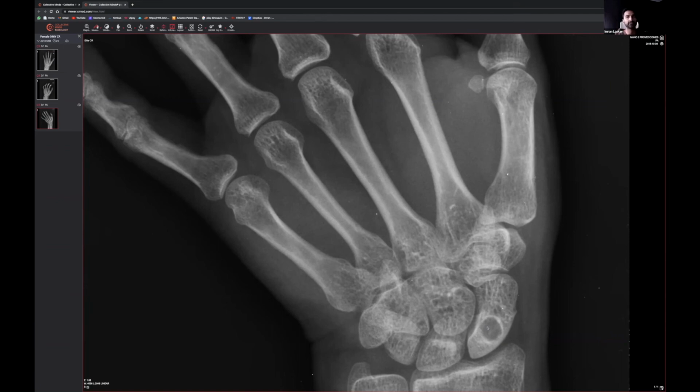And it's not just here you'll see these. You can see them on the shoulders, you can see them on the knee, the tibia mainly, actually. Now, you're not usually that bothered, but you have to imagine that you've got cystic transformation of the intraosseous structures, and that can actually result in slight weakness. So they can end up getting pathological fractures of these. So sometimes you do get fractures going through these lesions.